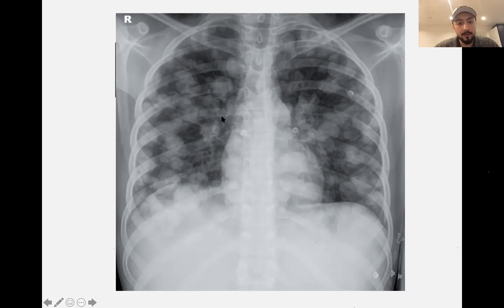If you look at the breathing, which is the lungs, you can see a lot of widespread, because it's spread all the way around the lungs, round and well-defined opacifications, multiple well-defined and round opacifications all around the lungs. And you can see the lung markings all the way to the edges, okay?